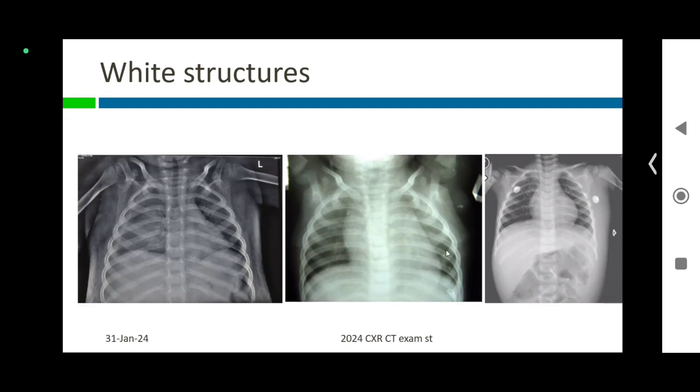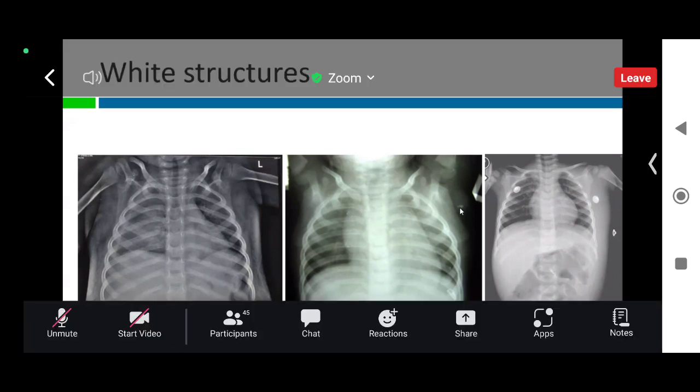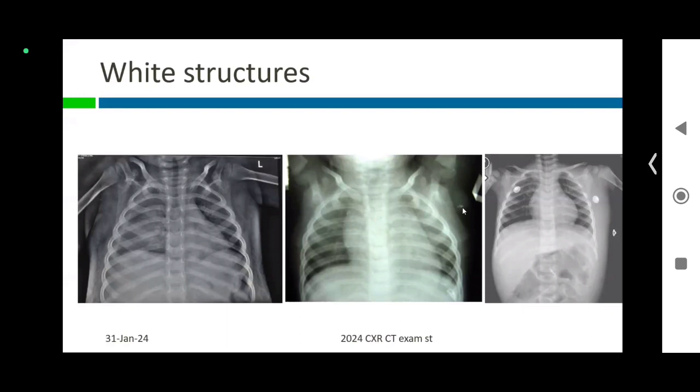Yes, in the next one, do you see anything else in the subcutaneous plane? No, sir. Nothing. Unilateral subcutaneous. Yes, unilateral. Yes, Sahana, but you look at this, there is no edema, but you look at this one. This has got the consistency or the appearance similar to that of a bone. It is a calcification. Where do you get calcification in the axilla? Only in the lymph node, a calcified lymph node. Okay, this is just for you to understand. Don't miss out anything like this.